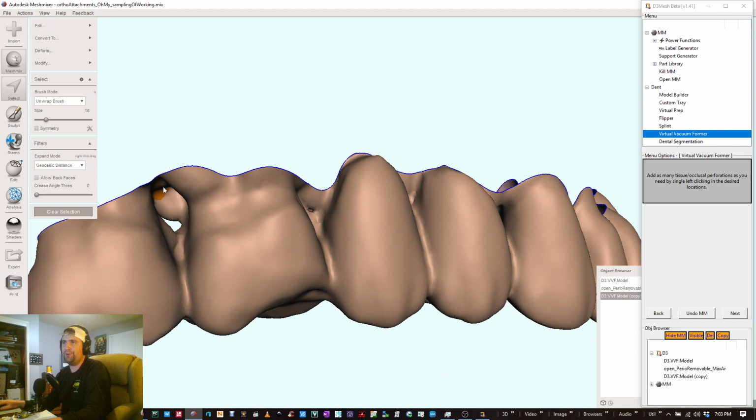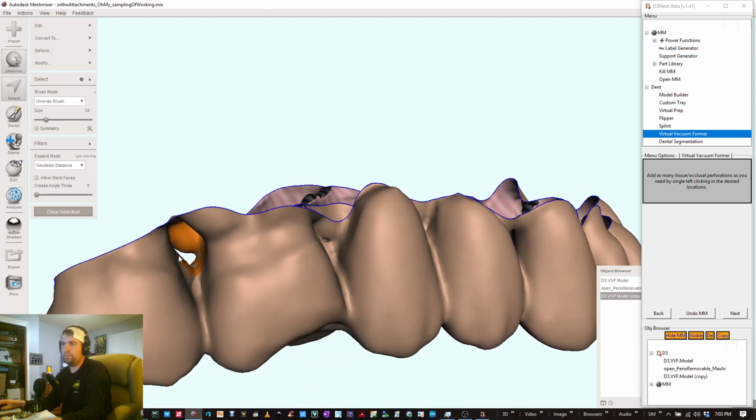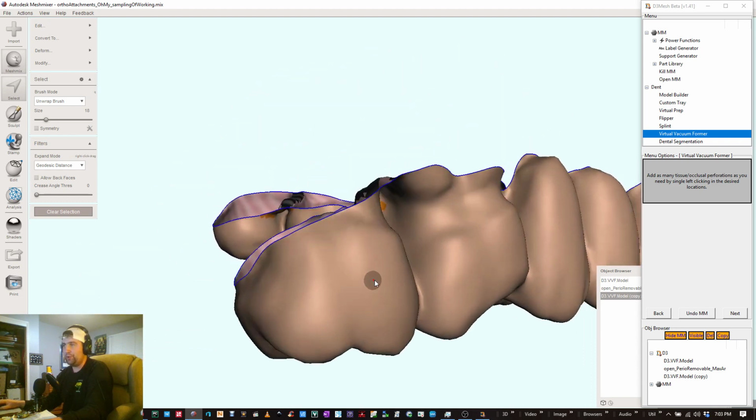I can't just start cutting corners now. All right. Not this part, it's just the underside here. Oh man, this video's going south real quick.